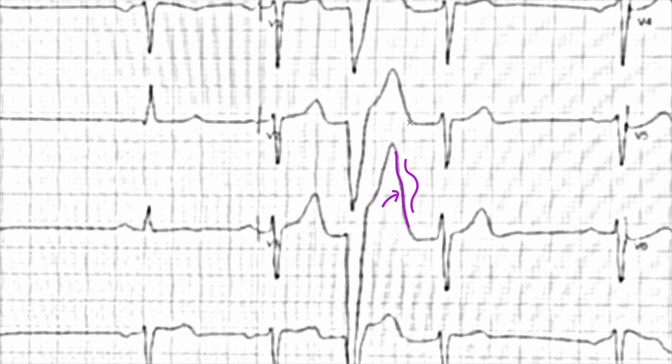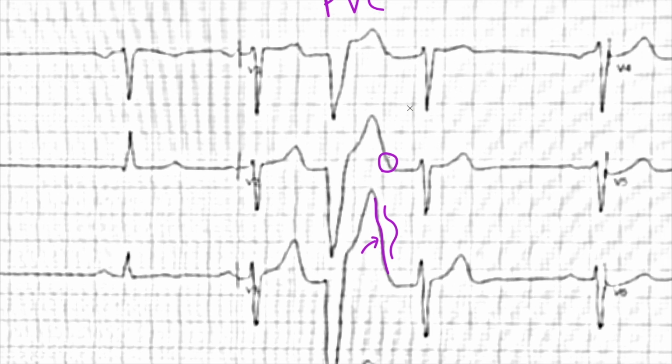Now if we follow this line up, there's a little bump right there. Difficult to see, but as you train your eye, you'll see it. And there's another bump right here. Let me undo that. You can kind of see it here. Boom. It does that. So there's something hidden right there. Okay. And if this is a P wave, then this would be a normal beat.